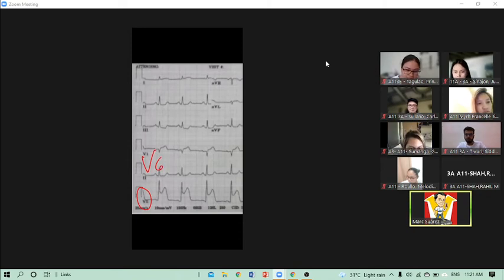The photo is a little bit blurry, but let's just say this is V6, okay? What can you say about this one?